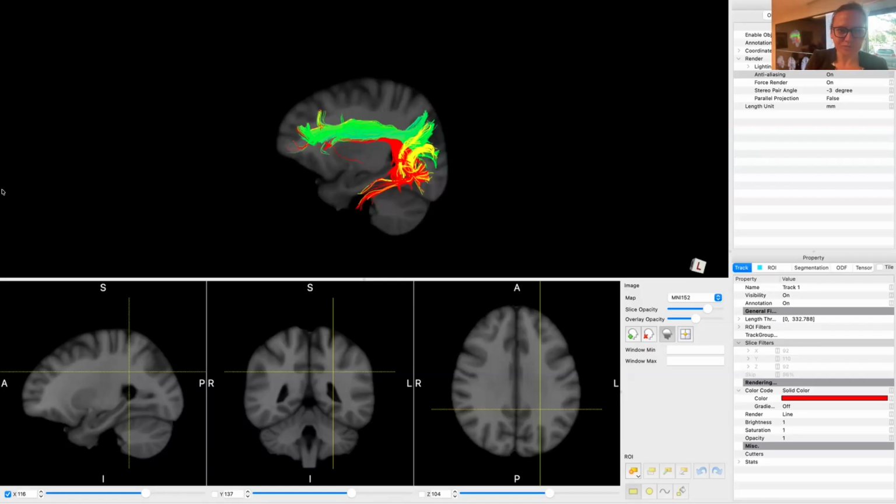Okay. Now, what I suggest we do for the next half an hour is we all did the left together now. You got to do the right on your own. And Valentina and I are here to help you. If you need it, feel free to help each other as well. But let's do the right hemisphere and see how it goes. 3 segments, right hemisphere, same approach. Go.